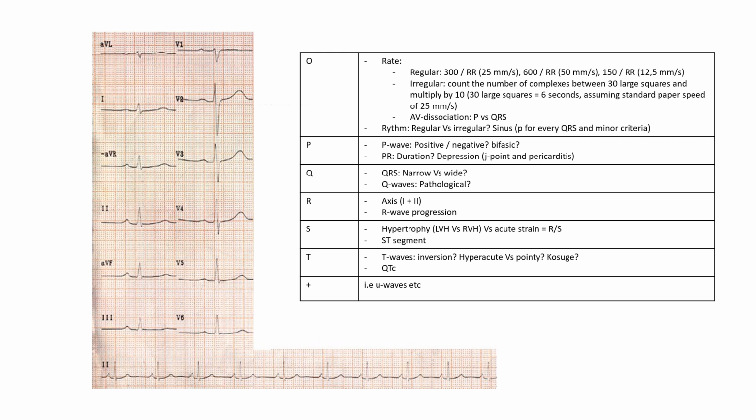Then you have right ventricular hypertrophy, and that's a dominant R wave here. There's no dominant R wave, and there's no dominant S wave. A lot of these criteria, right? If I screen the ECG and it looks kind of weird, then I have to look at Life in the Fast Lane to check the criteria. So that's what I suggest to you. I don't go around knowing all this stuff in my head, just the screening criteria, right?